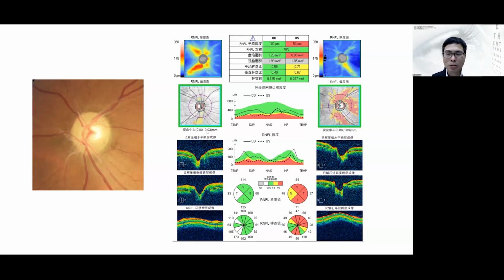The deviation map is not that useful. So relying on the thickness map representation is hard. It's not easy because it's not quantifiable, it's a qualitative assessment. But if you read these maps enough, I'm sure you will get a better sense of whether it is glaucomatous or not. So relating the disc configuration with the retinal nerve fiber thickness map is an important approach in the diagnostic evaluation of glaucoma.